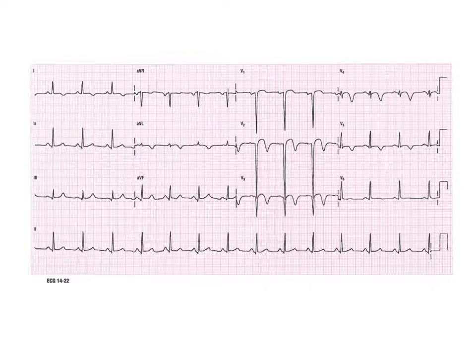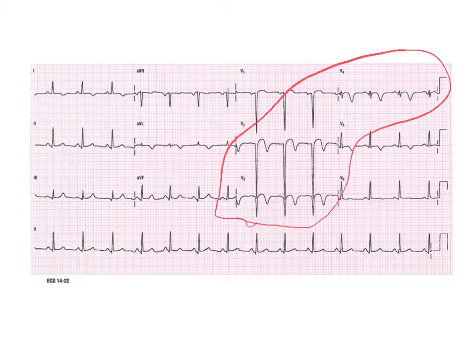So now it's just down to ST and T wave changes. And so then our eyes are kind of drawn to these yet again, and it looks like we have some ST elevation with a flipped T wave right there in V2, probably the same thing in V3, so at a minimum serial EKGs, and we're very concerned about some anterior ischemia here.